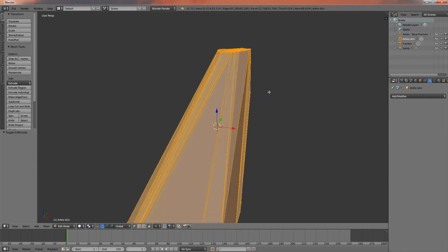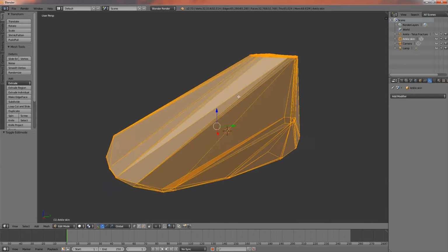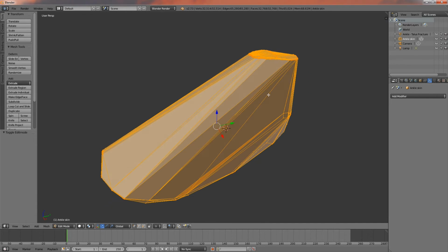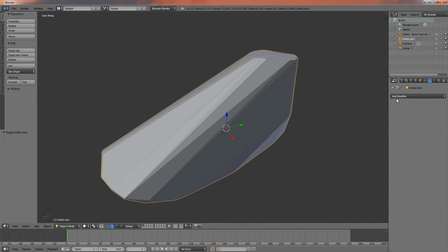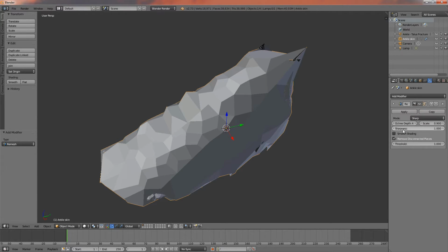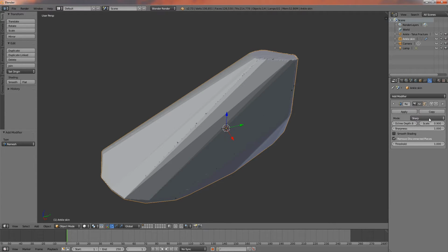And really, given those large triangles, there's only so much that Blender can do in order to fit this around our structure. So in order to alleviate this problem, we apply a remesh modifier. So we'll go to remesh. Want the octree depth to be somewhat high because this is a detailed model. So let's set that to 8. We want smooth for the mode, and we do not want to remove disconnected pieces.